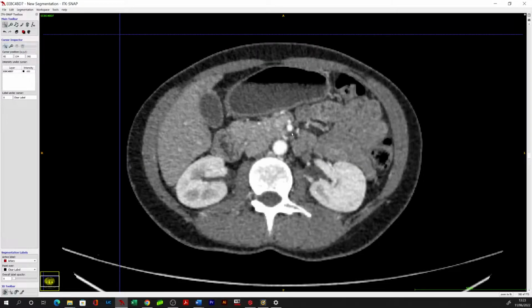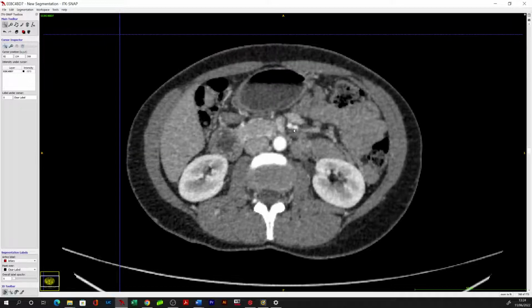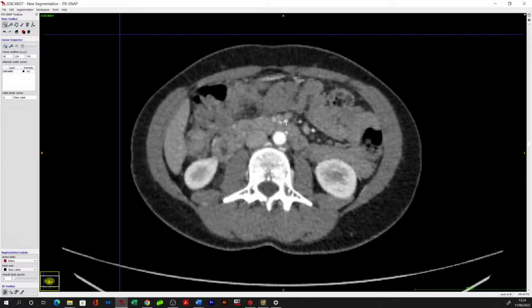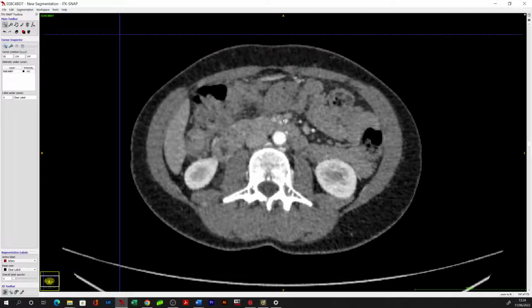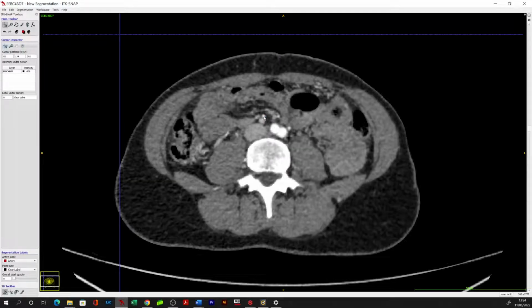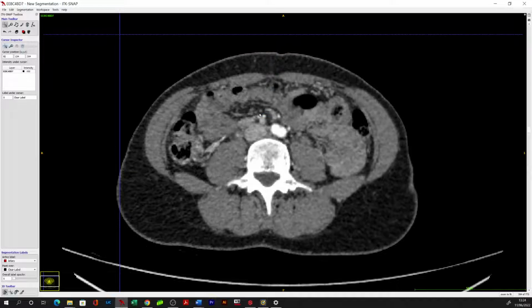So let's go back up to the origin, and we notice that we've got these jejunal branches coming out laterally, and a larger one here, and here we're observing the ileocolic artery in all likelihood passing posteriorly with respect to the SMV, and then coursing laterally, which we can follow. And there's probably a little bit of a bifurcation here. So this then bifurcates.